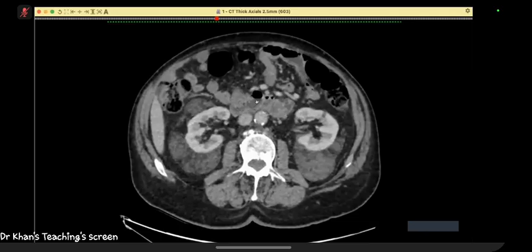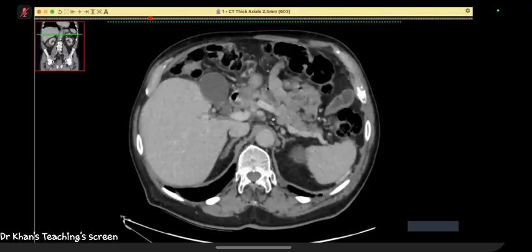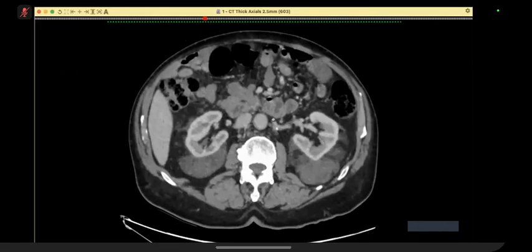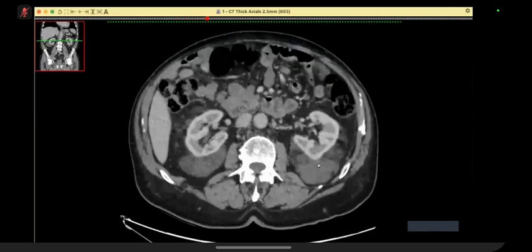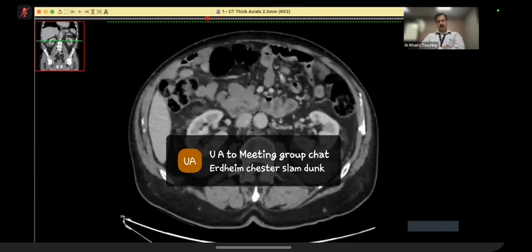So to conclude, these could be angiomyolipomas or perirenal collections. Also, I'm keeping a differential of lymphomas. However, the renal parenchyma appears normal. This could also be a spontaneous hemorrhage involving both kidneys, which is limited by the perirenal fascia. In my routine practice, I would like to correlate with the history of any hypotension in this patient. No history of hypotension. Okay.